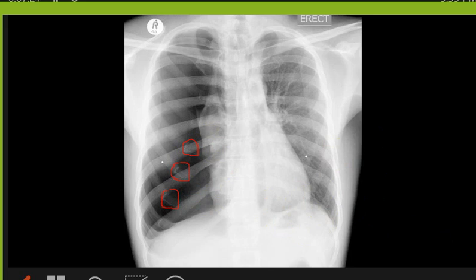Right pneumothorax. The collapse. Okay, with collapse of the right lung. You should mention the right pneumothorax in the various scenario. Second, you should mention this is tension pneumothorax. Pneumothorax alone is not enough. This is a tension pneumothorax. Why? Because almost all the lung on the right side is almost collapsed.